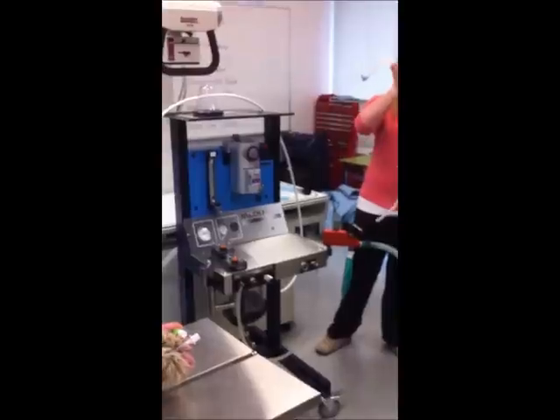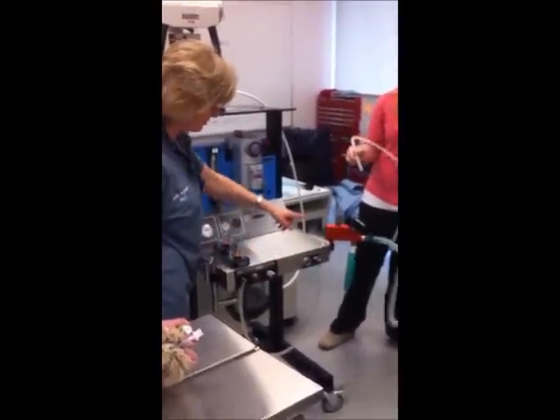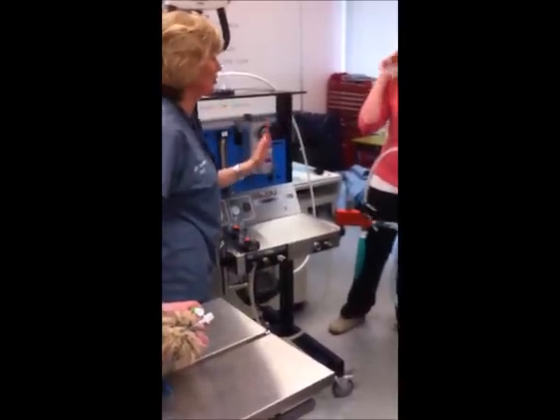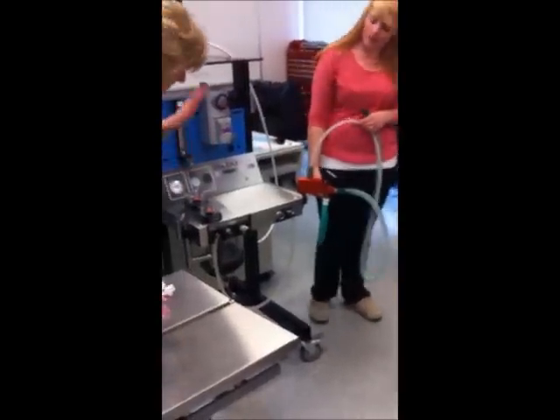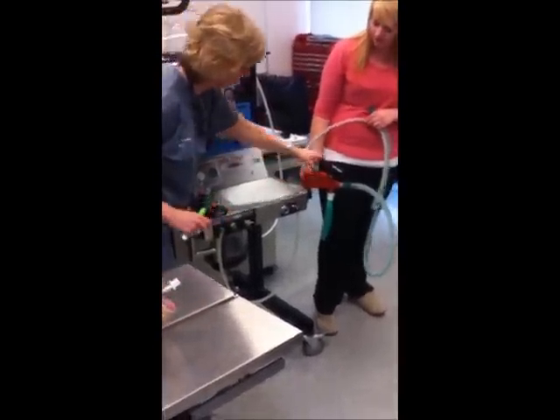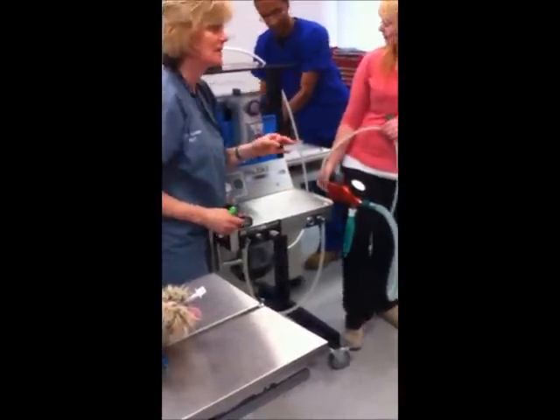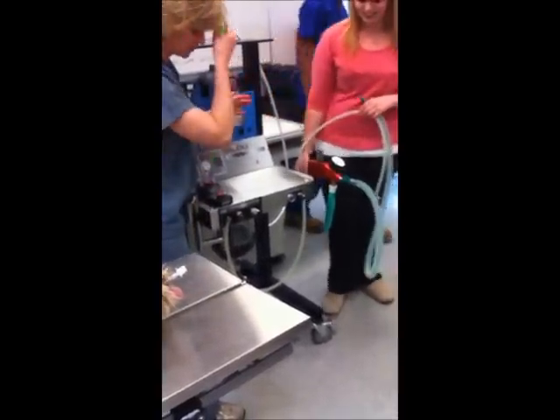So can I make an example of this? If in your practical you are doing this and I see that you've hooked this up and then you go looking for that one, I know that you're not sure. I don't want to point anything out with Nikki, but you need to know where this stuff goes. And this system particularly can be a little confusing because you've got 3 outlets here that are all very close and very much the same size.